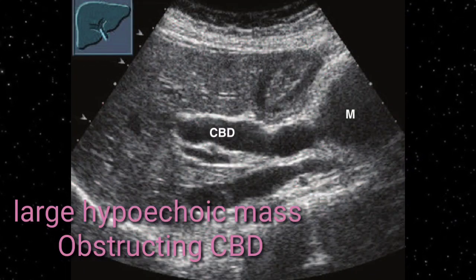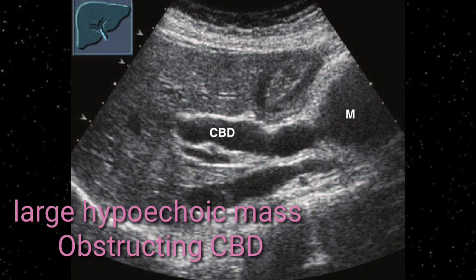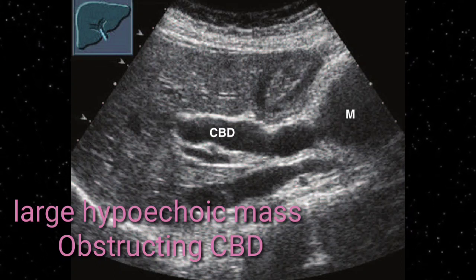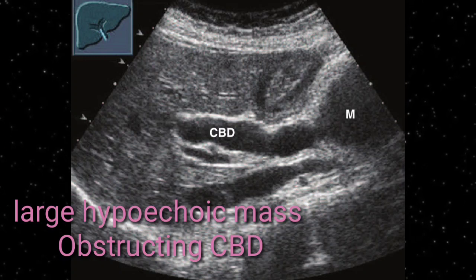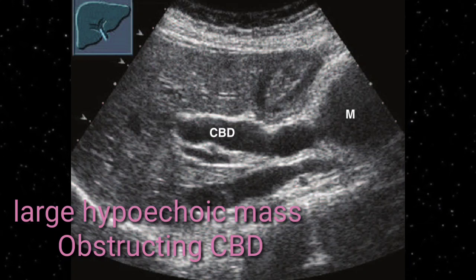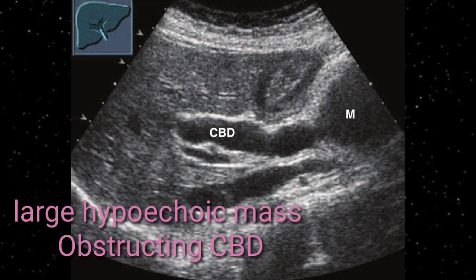On this image, a large hypoechoic solid mass can be seen in the pancreatic head region. The mass is well defined and annotated as M. The CBD is seen clearly dilated. This head region mass is likely pancreatic ductal adenocarcinoma obstructing the CBD. You can see the mass appears hypoechoic and is clearly defined.